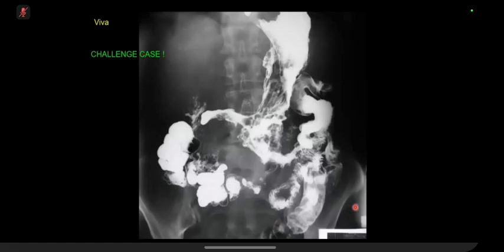Okay. The stomach looks slightly abnormal. There's irregularity of the lesser curvature and the greater curvature, with perhaps some areas of ulceration. The duodenal cap looks a little bit narrowed, but then the D2 and presumably D3 segment looks okay. The distal duodenum and the jejunal loops look, again, abnormal. They look slightly strictured, narrowed as well.